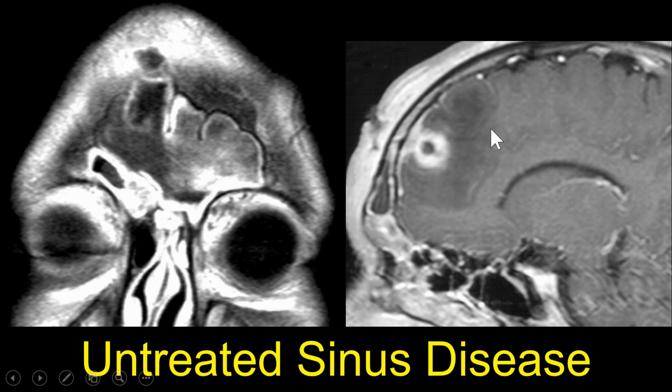And here you see all the low intensity. So again, remember on MR, we talk about intensity, and on CT, we talk about density. We have a lot of low signal intensity in the frontal lobes of the brain, consistent with vasogenic edema. The brain is angry about this abscess at that location.